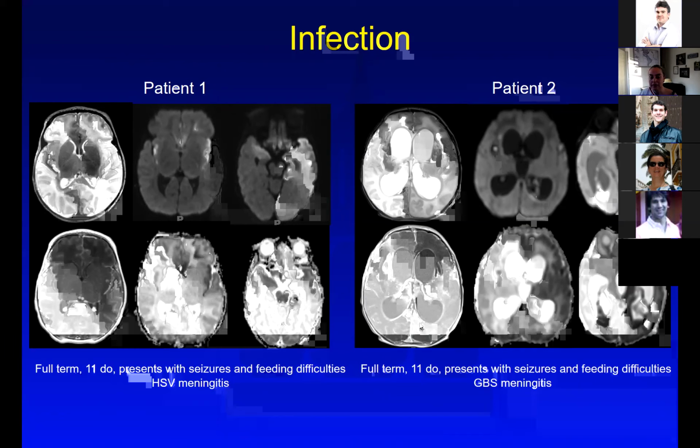In these infants, another concern would be vasculitides. Vasculitis can accompany these infectious processes, which can further contribute to these cystic changes. But the restricted diffusion is quite striking in this patient.